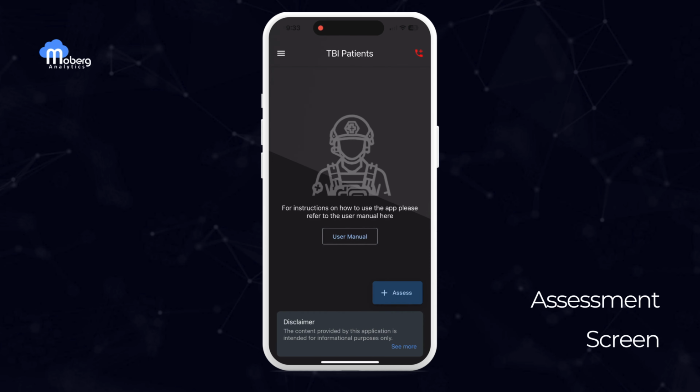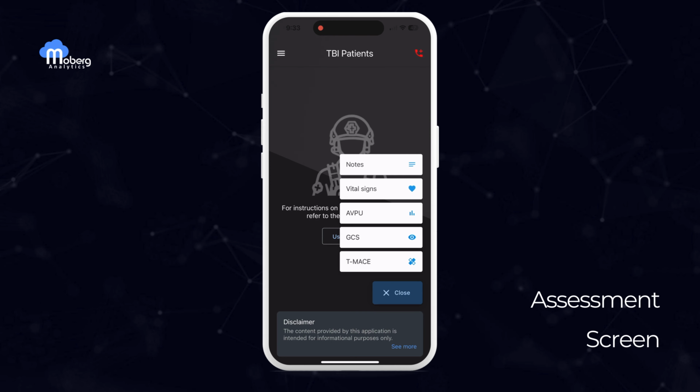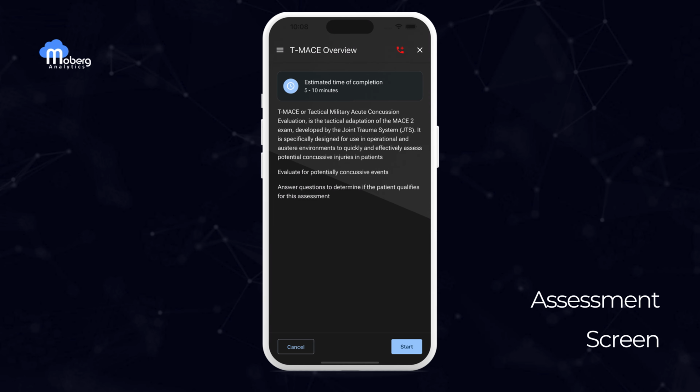Let's start with the T-MACE assessment for this demo. First, I'll tap on Assess to open the menu. Here, we can see different options like Notes, Vital Signs, AVPU, GCS, and T-MACE. I'll select T-MACE to begin. Next, we're taken to the T-MACE overview screen. It gives a quick summary of the assessment with an estimated completion time.